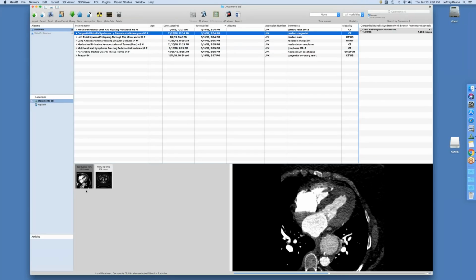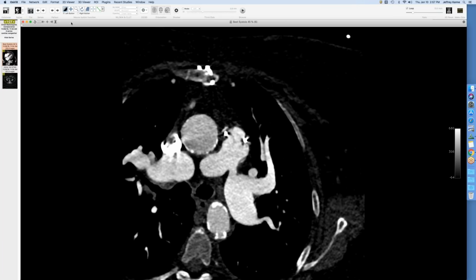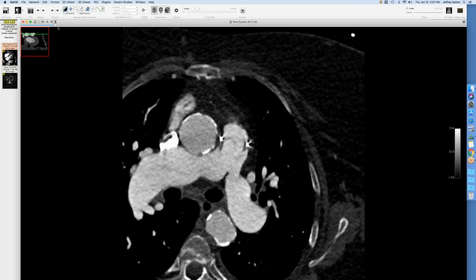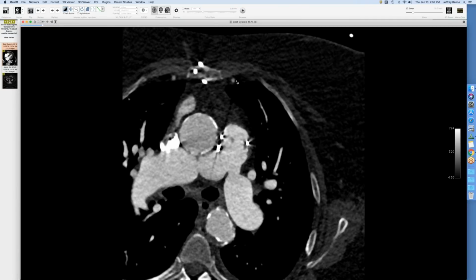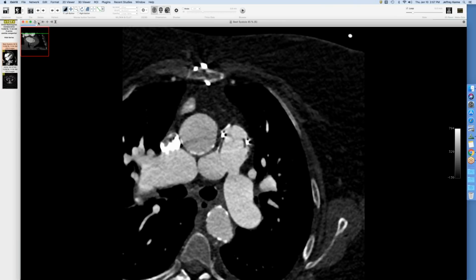And last, it seems to be a cardiac day. This was a cool case that was also shared with me by one of my colleagues. This is a 53-year-old woman who has known congenital rubella syndrome and has had a pulmonic valve replacement. And she presented for imaging because she has some other issues. But you can see she's got these branch pulmonary stenoses with these aneurysms. And that's a known complication of congenital rubella, is pulmonary stenosis and branch pulmonary stenosis.